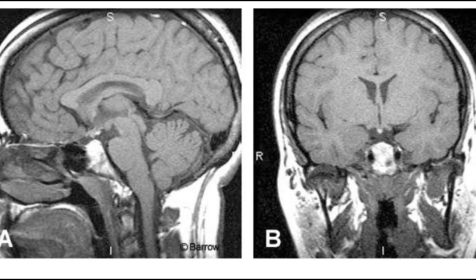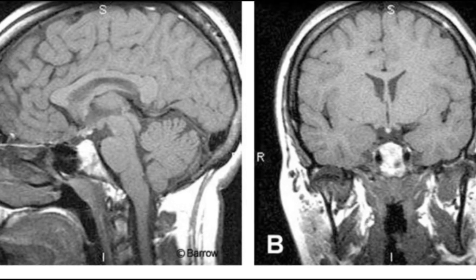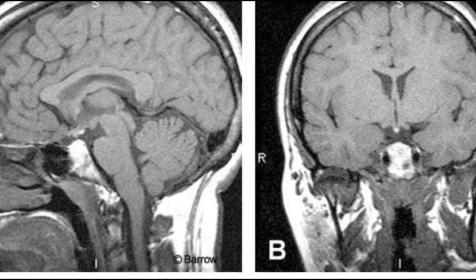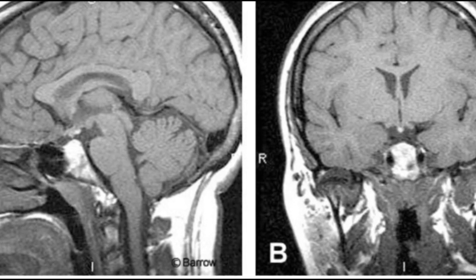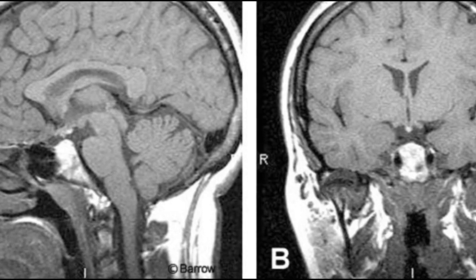Potential differential diagnoses: the appearance of a well-circumscribed, enhancing mass in the sellar region in a 17-year-old female, as noted in the patient info, could be consistent with several possibilities. Pituitary adenoma, a common, typically benign tumor of the pituitary gland itself.